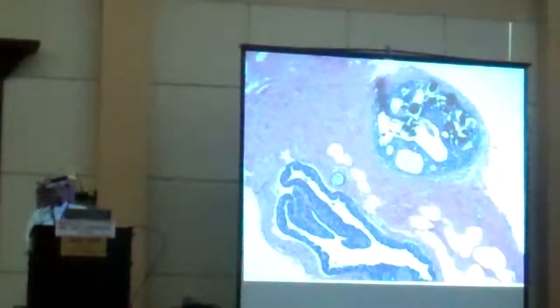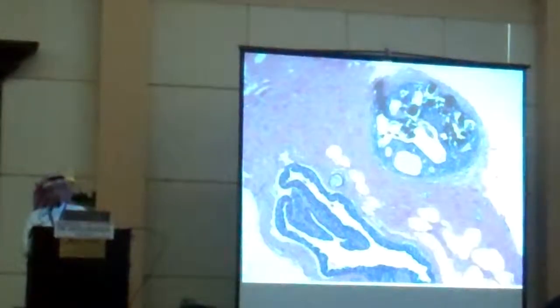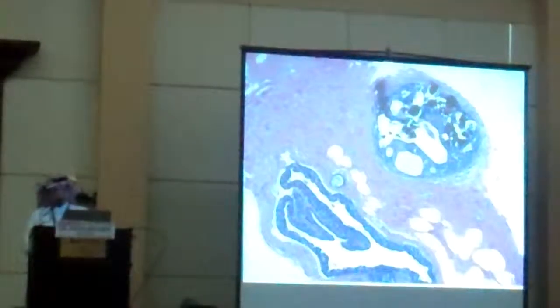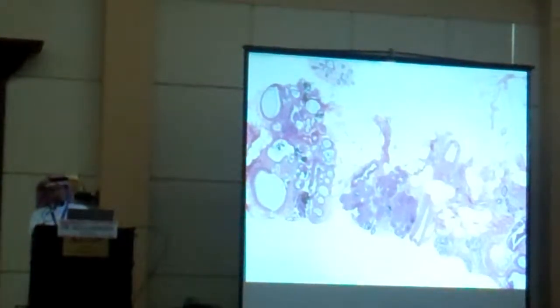I will mention whether it's luminal or stromal. It's easy for us to mention this, but in routine, I mention whether there is microcalcification or not. And I would like the radiologist to tell me, do they see microcalcification or not? This is really helpful for us. This is another appearance of microcalcifications. We see it within the lumen. We see it also in the lobules.